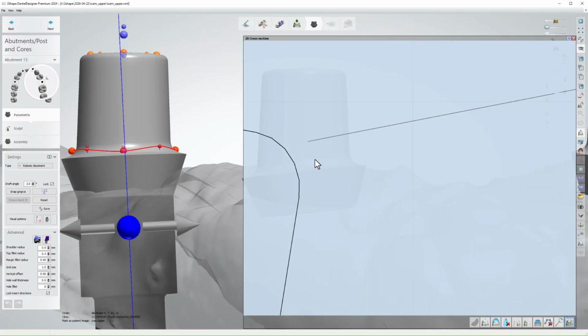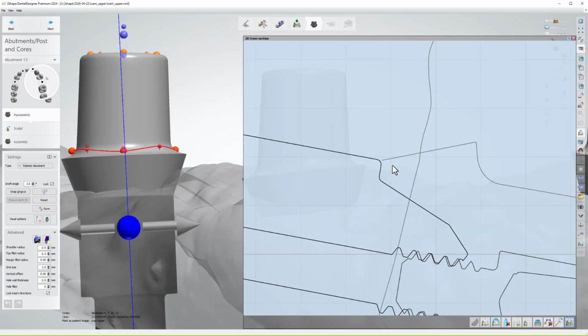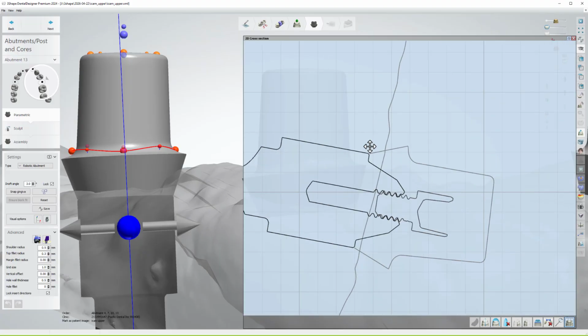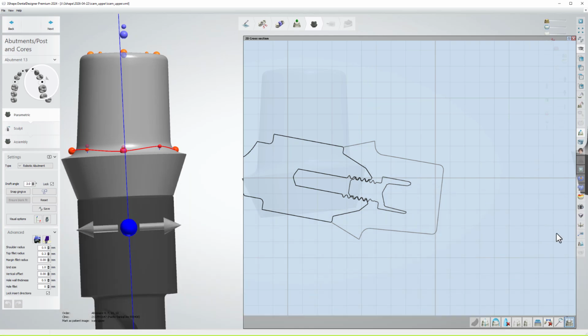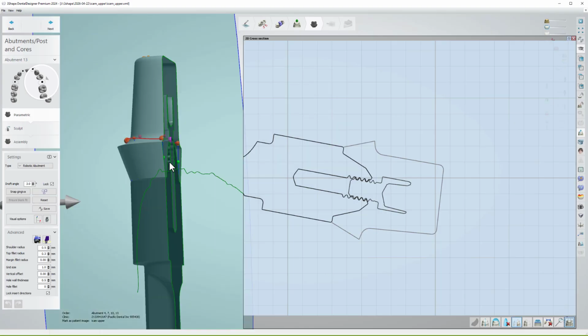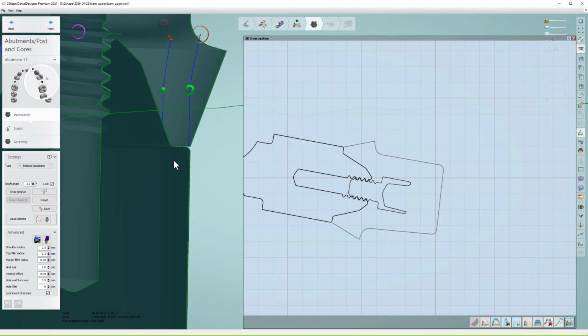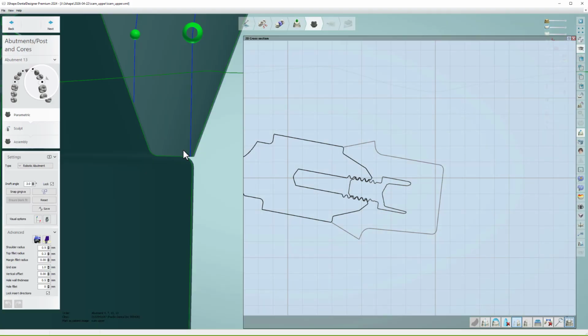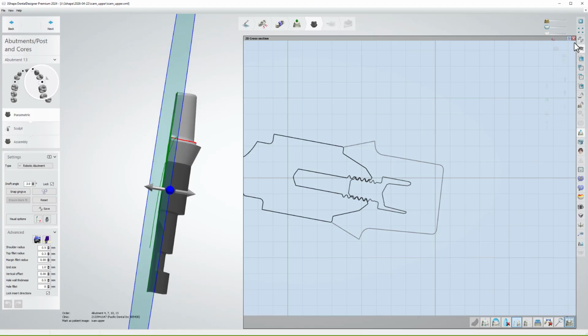Okay, we got a little issue, it seems, but no, it's not. Here, you can see this continues straight. So again, Nobel seems to be at the same plane as all of these other ones.